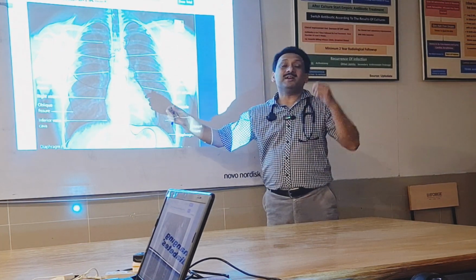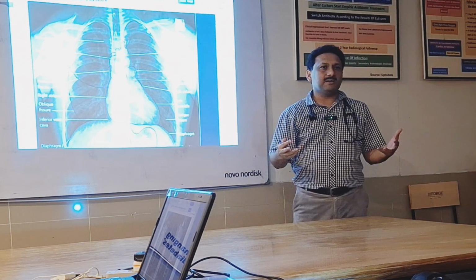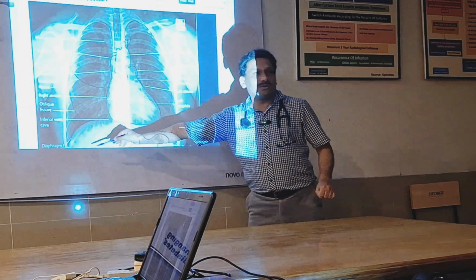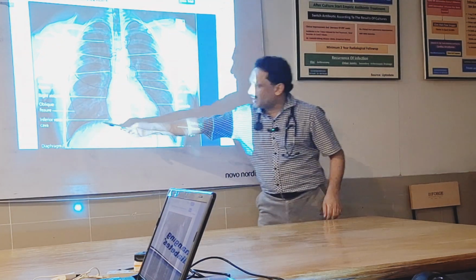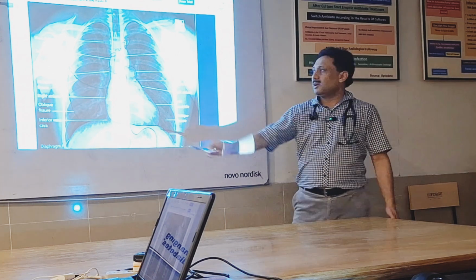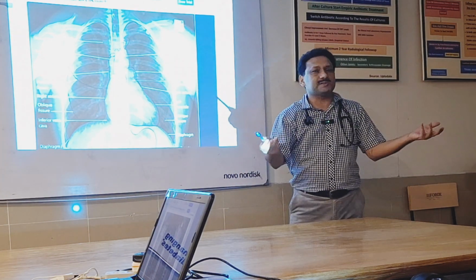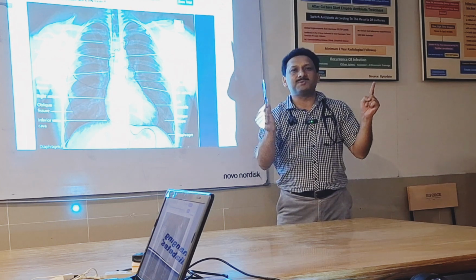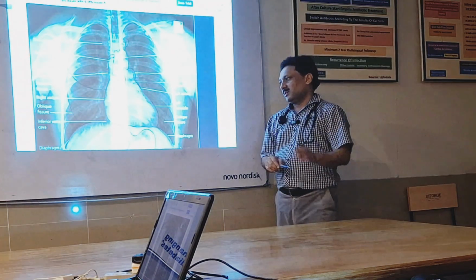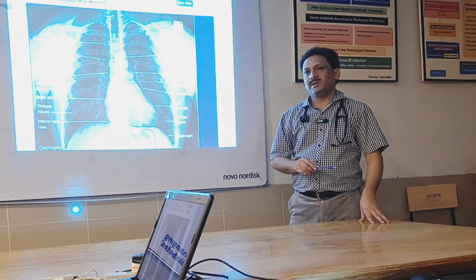If a patient has a hyperinflated lung, then what will happen? Anterior rib number 8 and onwards will be bisecting the mid of the diaphragm. So that X-ray will be taken as hyperinflated. If the 4th is bisecting, there can be reduced volume due to some disease process, or the X-ray has not been taken with proper inspiratory effort.